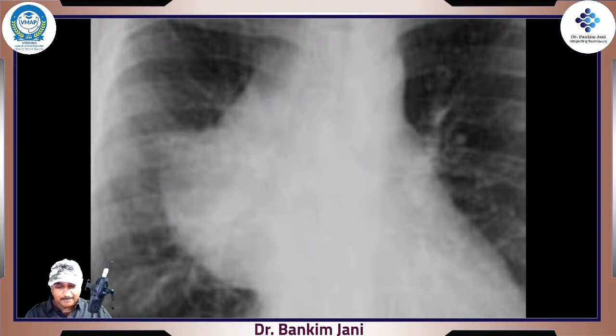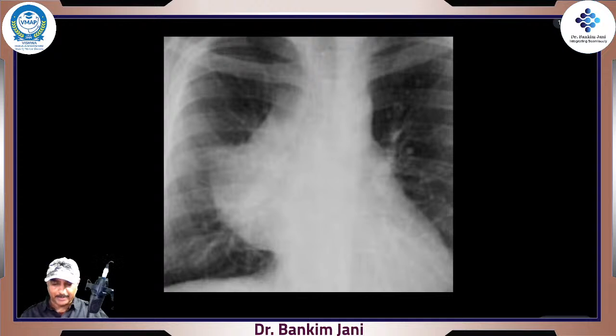Do you see? That's right. This is okay. SOL in right lung, right? SOL in right lung. Wait, we'll see. But yes, there is SOL, a space occupying lesion.